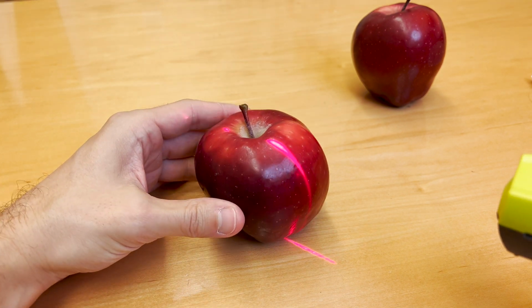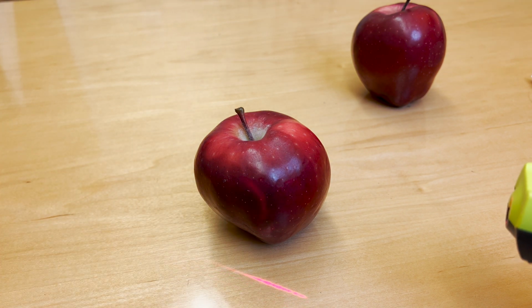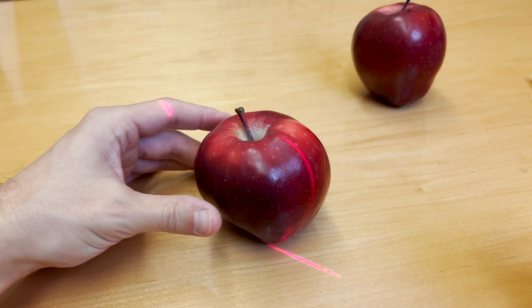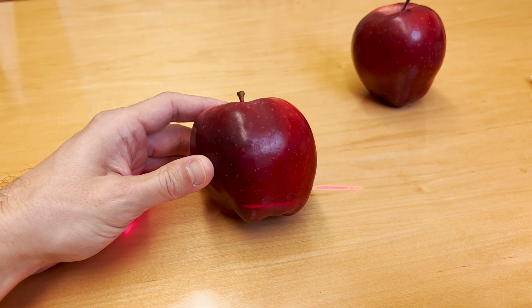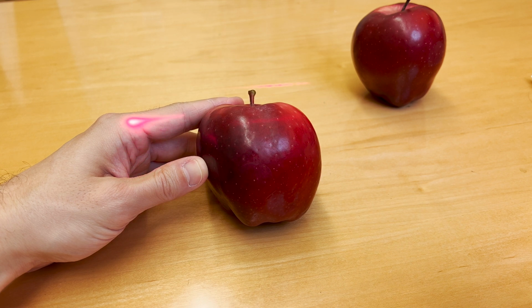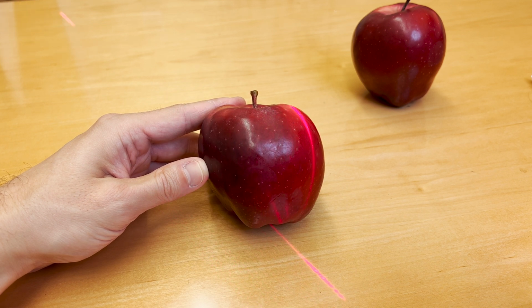So what we could do is, if we think of the image as being produced as cuts go through the MRI, as you see, as my laser goes across the apple, we can make cuts through it in this orientation. And then we can also make cuts through the apple, if we rotate it, in this orientation. So you see how that line moves up and down through the apple, or we can make cuts through it this way with this orientation. You can see how that laser line moves across it just like that.